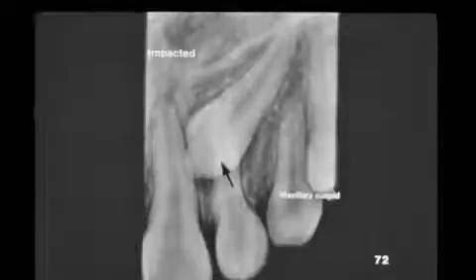The primary canine is present, letter H. Notice the attrition on the incisal edge, the large bulkiness on the cervical of the crown, and the shorter root. This root tip is in soft tissue. Usually we see root tips as radiopacities in bone where extractions have occurred. Notice the rampant caries present. Tooth number 14 has supra-erupted to fill the place where the caries have eradicated tooth structure on the mandibular teeth.